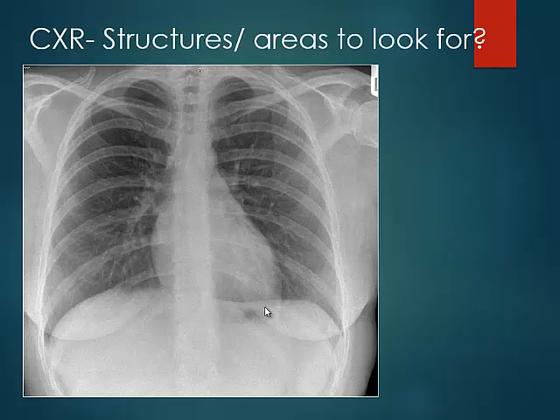Pulmonary edema. You mean the lung parenchyma, or you mean the pulmonary vessels? So pulmonary vessels are important. From a cardiac perspective, pulmonary vessels are important. But obviously you're looking at the lung parenchyma as well, looking at the hila, you're looking at the bones again. So all these provide different information. The most important structures you're looking for in a cardiac patient is pulmonary vasculature.